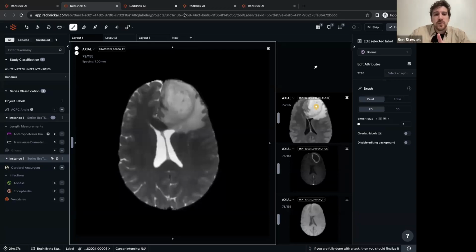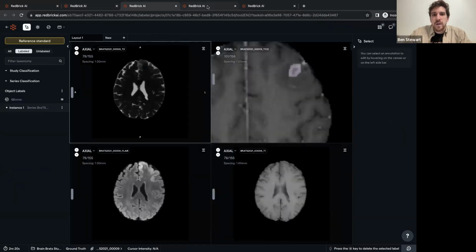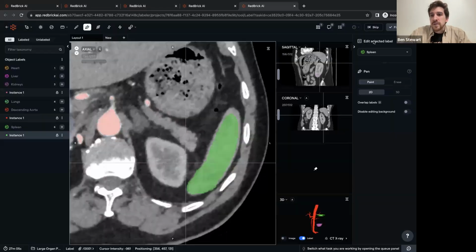Actually, Yashavanta, if you don't mind, I will do that right at the end. Could you kindly tell me if this T2 structure will be okay? And I will wrap this up very quickly, and then I'll come back and do the grow tool version of this T2. I'll just do the ventricles or the white matter or something. So Yashavanta, please let me know if that's okay with you. And we will just wrap up here with task states.